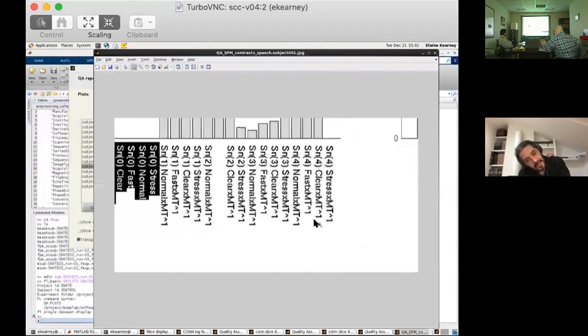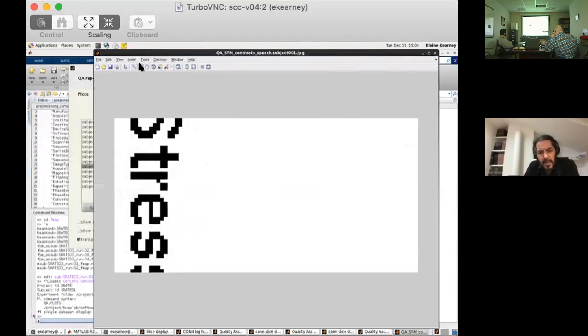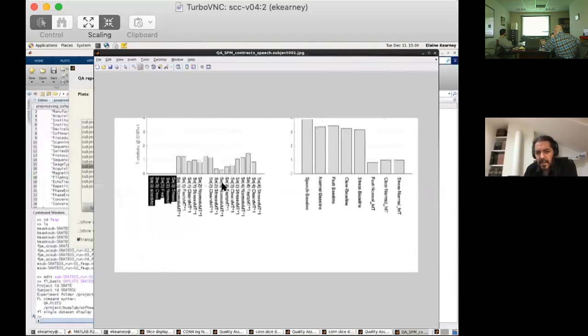There you go. Let's see. So we're looking at the normal times MT, the covariation. So MT was reaction time, or what was it in this experiment? MT is duration. Yeah, the duration, right.